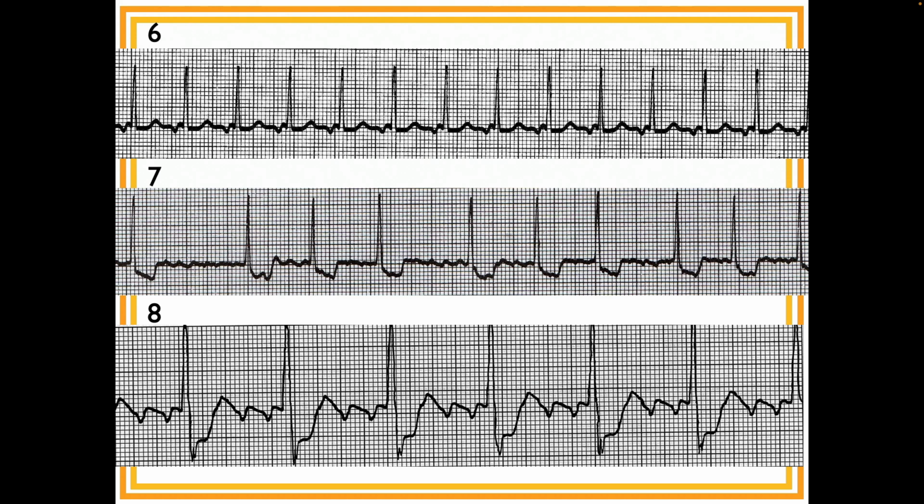This one, it's like I need a few more vitamins for this because it's not super easy on the first one. It's kind of like the last one I did, where it's an irregularly regular rhythm, but again, that first one is a lot larger than any of the other ones that are repeated. I'm going to go with the regularly irregular.